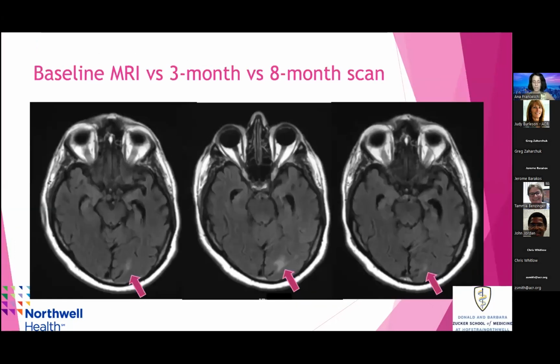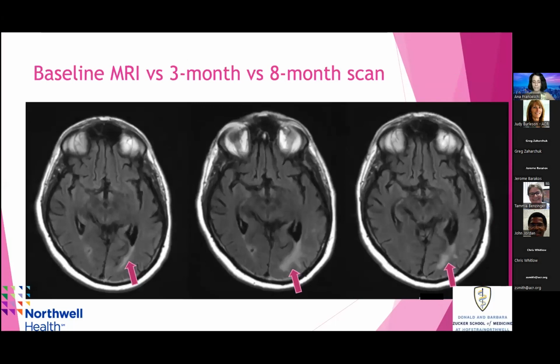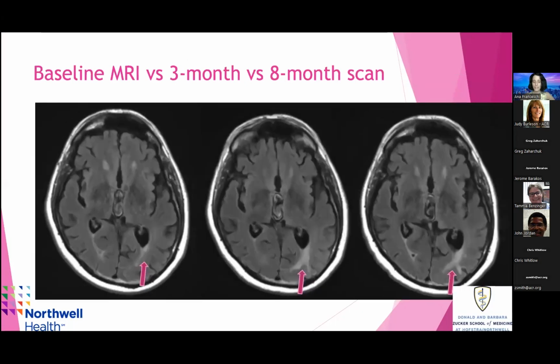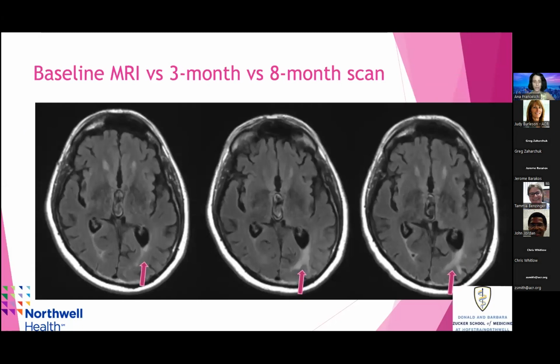Here are just a couple of slices of that same patient, so you have a sense of the extent of the abnormality. And again, even though radiographically by 8 months, these findings were improved, clinically, the patient was not doing well.